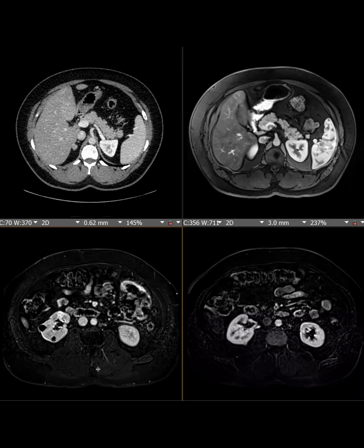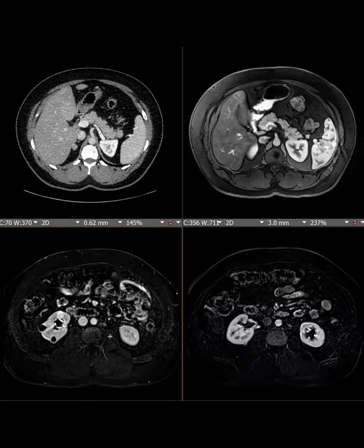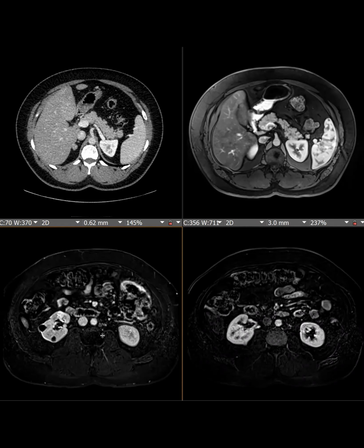So renal and pancreas make me think of von Hippel-Lindau. That is what this is, yes. Oh, yeah, that's what Roopa said too. And then in the adrenal, does VHL give you paragangliomas or others? I think they get neuroendocrine tumors in the adrenal gland. They get hemangioblastomas in the CNS. I don't have the CNS imaging up, but this patient has that as well.